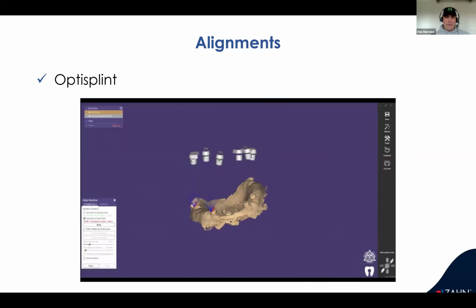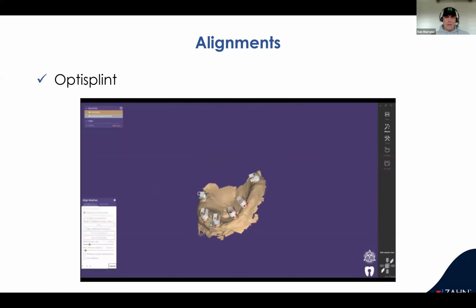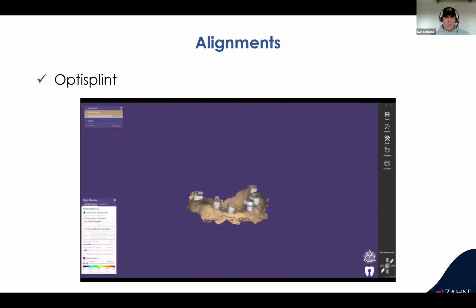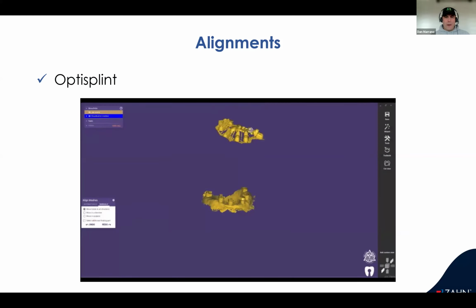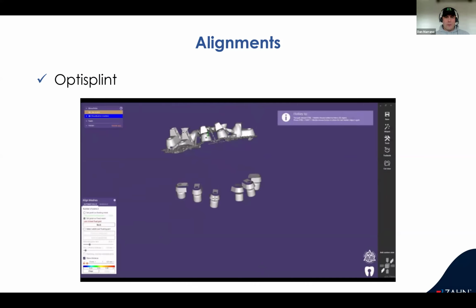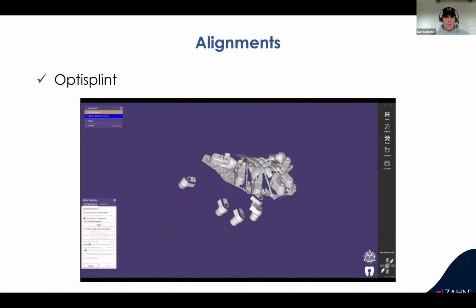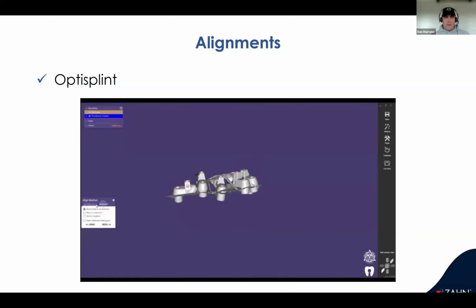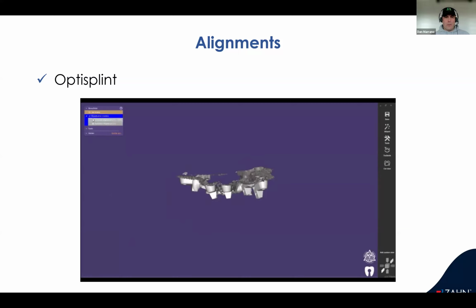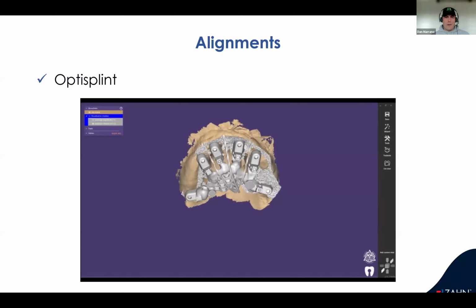and you would then align the healing caps, the MIS healing cap file. And then you bring your OptiSplint back in. And now you realign your OptiSplint to that healing cap file that you had created. So now you sit right on top, and you can see there, if you saw it real quick, why you couldn't do a one-for-one direct, because these are sitting a little bit higher, actually. The MIS healing caps are a little bit shorter. But now you can see real quick.